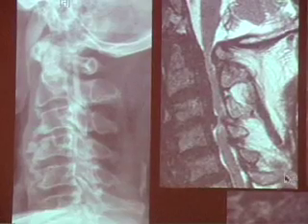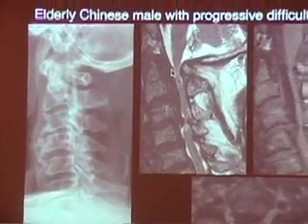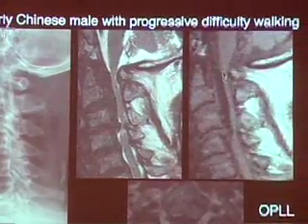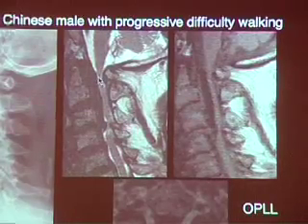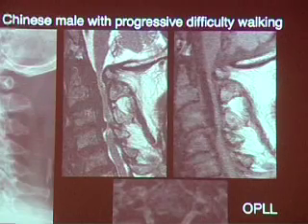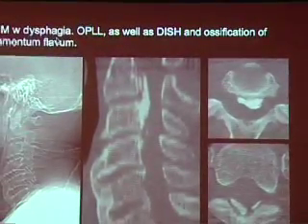When he subsequently underwent an MR scan, you can see on the sagittal T2, sagittal T1, and axial gradient echoes that he has this thick band of ossified posterior longitudinal ligament. He has spinal stenosis, which is so severe that it's scary. And when you look at his spinal cord, you can see that in multiple places, not only is it thinned, but he also has areas of T2 hyperintensity that, given the chronic nature and progressive nature of his condition, presumably represent myelomalacia.